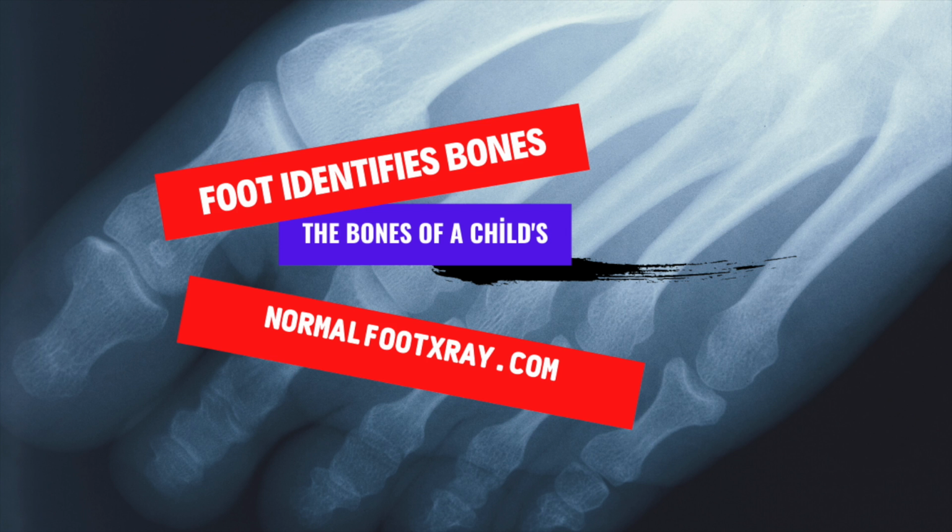It can help doctors identify the position of foreign objects in a wound. Children can undergo an X-ray of their feet if they are suffering from an inversion injury. The bones of a child's foot do not look like those of an adult. Normal foot X-ray. This is due to the fact that the foot's bones are not fully developed.